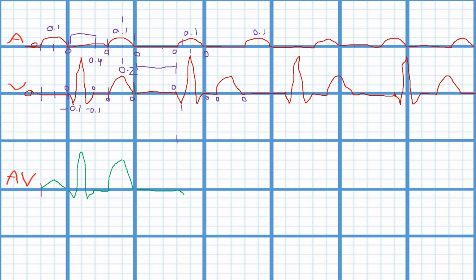And so what we got is 0.1 plus 0.4. And so 1 plus 4 is 5. All right. And so we're going to add these things together. We're going to add 1 plus 4 to get 5. And so we're going all the way up here to 5. And you notice this thing's symmetric.